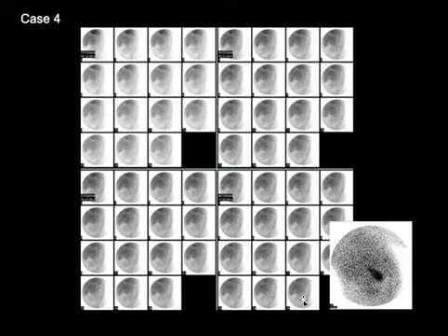Now, in this situation, when the liver is not taking up the tracer and the cardiac blood pool activity is persisting for a long time, the diagnosis is hepatocellular dysfunction from either hepatitis or from some other cause. Liver is not taking up the tracer, the hepatocellular function is impaired, and that's the reason why the liver is not able to excrete the tracer.